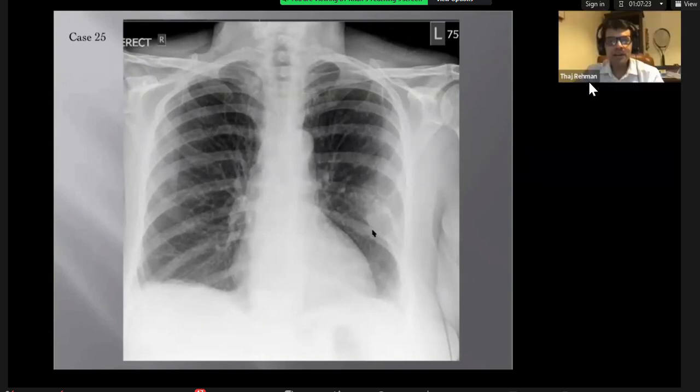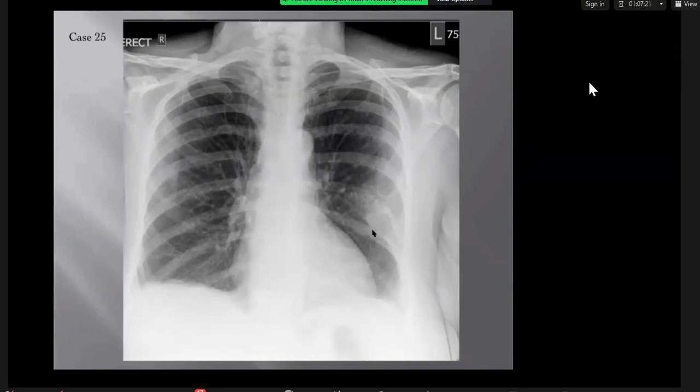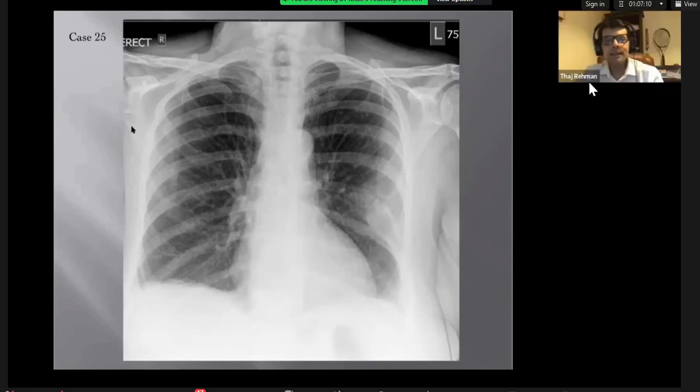Very good. So the patient, obviously I don't know the patient, I think a female patient, may have had right-sided breast surgery and is now presenting with a metastatic lesion. Such extensive axillary clips happen when there is previous axillary clearance. Axillary clearance is commonly performed in breast cancer with positive axillary lymph node metastasis.